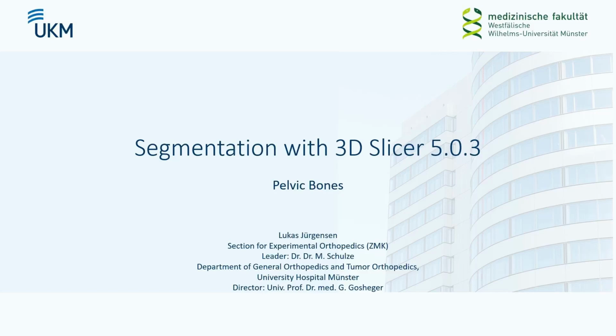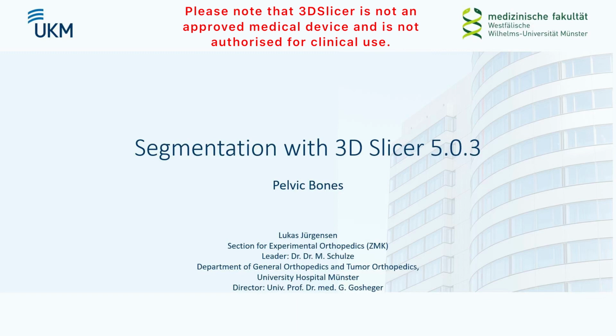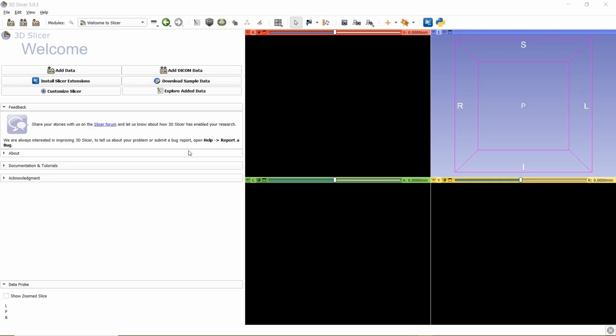Welcome to this tutorial for bone segmentation with 3D Slicer in the version 5.0.3, using pelvic bones as an example. Here you can see the start screen of 3D Slicer, which opens directly after starting the software.